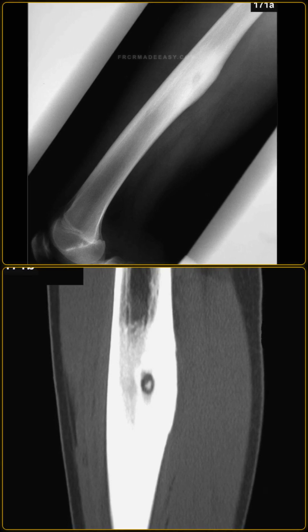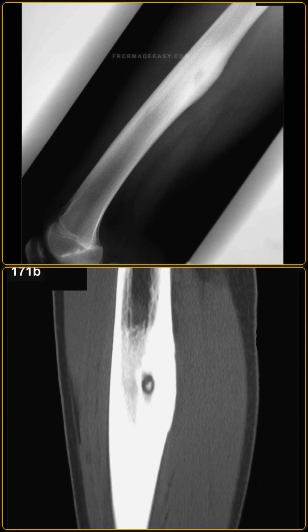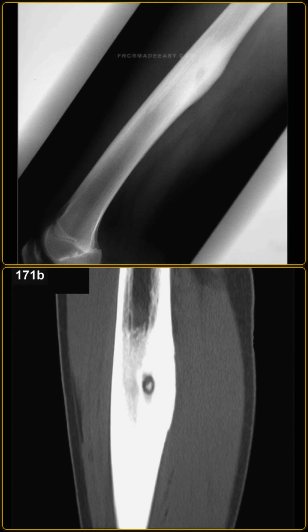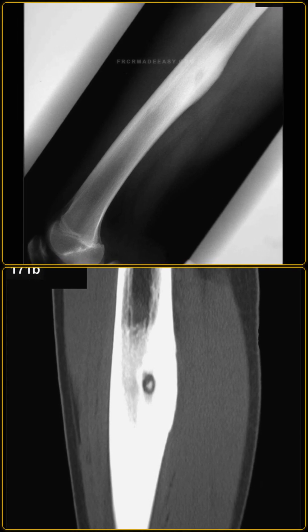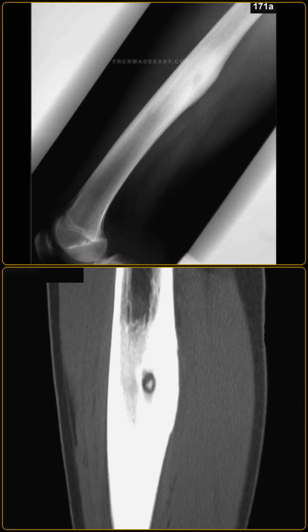Well, as a radiologist, I would recommend comparing these images with any prior radiographs to confirm the chronicity of the cortical sclerosis. Since radiographs are highly suggestive, I would recommend obtaining a dedicated thin-section CT of the femur to precisely map the coordinates of the nidus. I would promptly communicate these diagnostic findings to the referring orthopedic team.